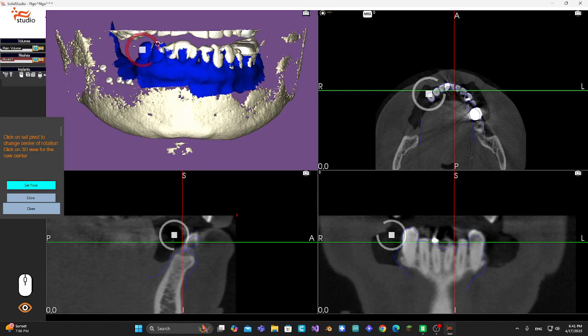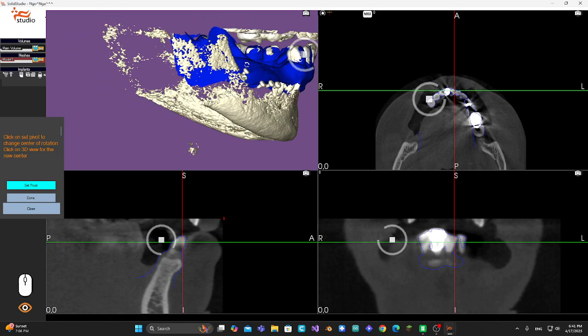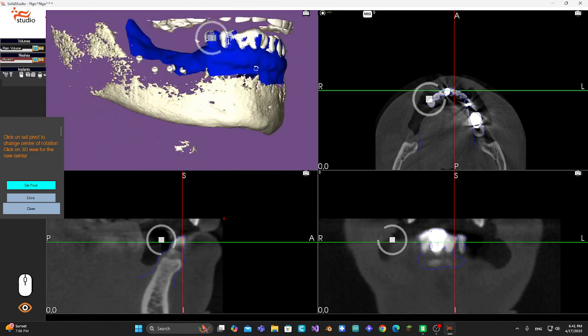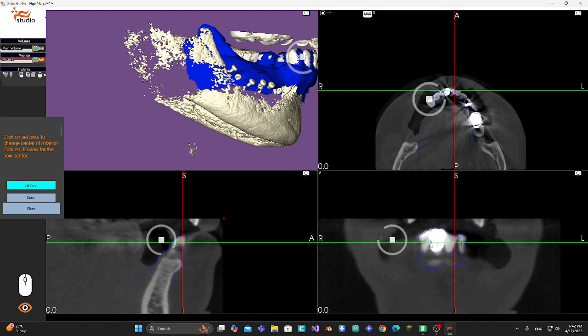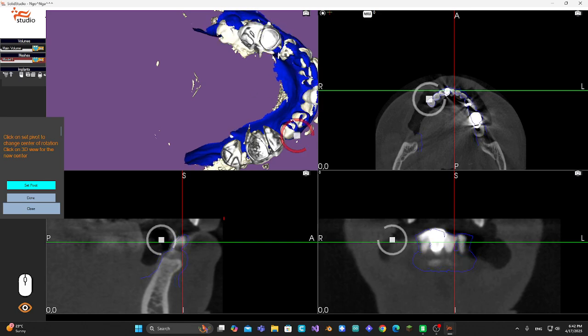Okay, now as you can see here, this point will be fixed, and you can check that the matching is proper. You just go to a different view to change the rotation angulation. Now this rotation circle rotates the model along the view. So if you're looking from the front, you can rotate it right and left. And if you rotate it to the right, the rotation will be anterior and posterior. So if you look from above, you can rotate it like this.